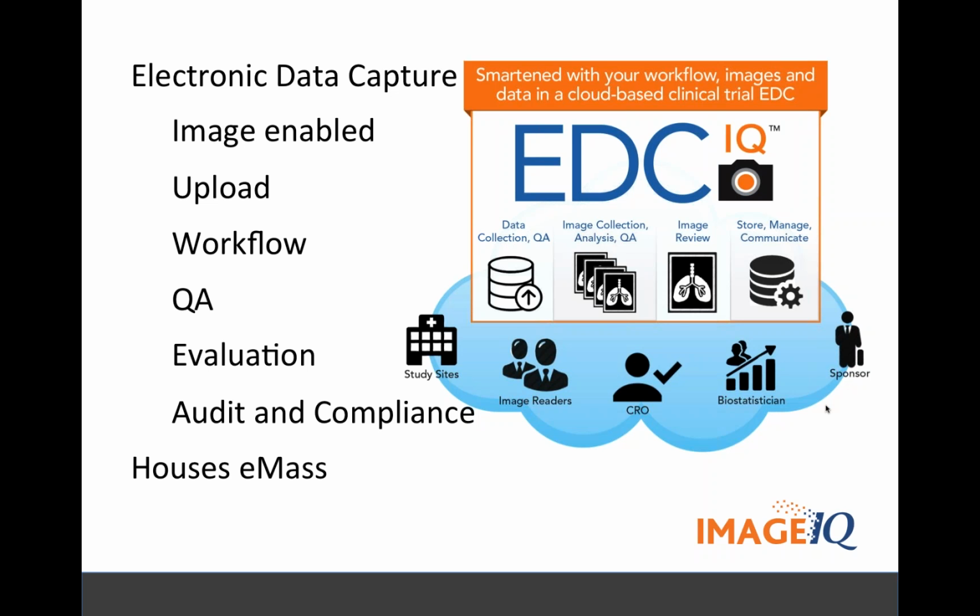So you've probably run a clinical trial where you have to do a bunch of queries at the end of the trial. This prevents that because it's doing the checking live as the reader is making their measurements. As that's all being done in the system, they sign off on it. It's saving all of those regions that they're drawing.